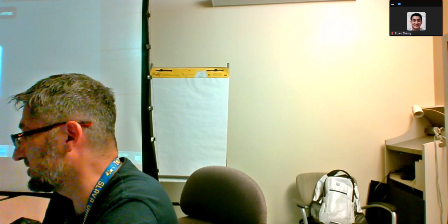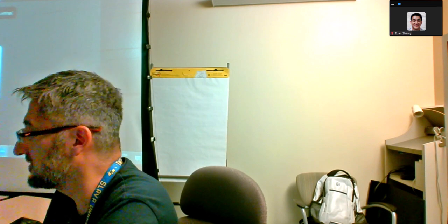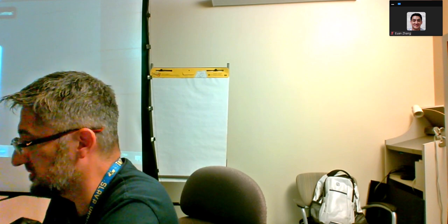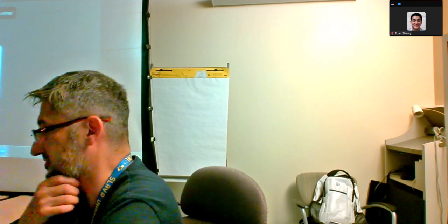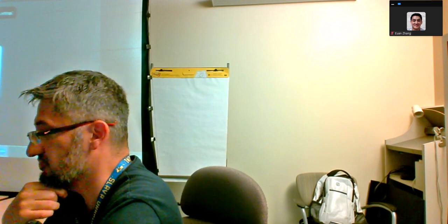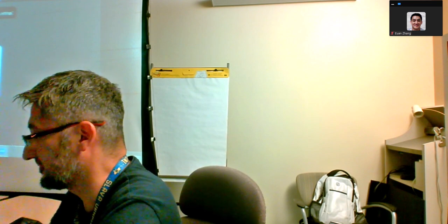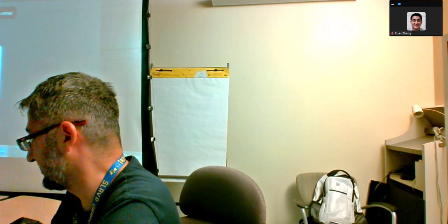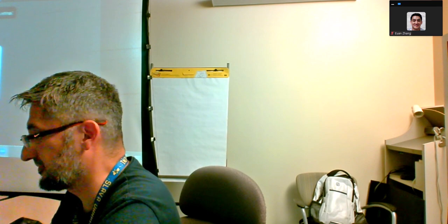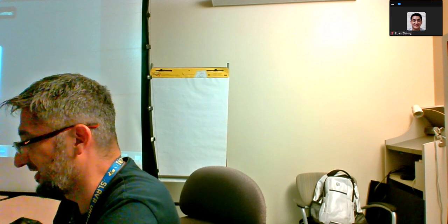Second question. What is the grade of the germinal matrix hemorrhage? Look at the images carefully. I will give you 20 seconds. Now. Okay, everyone answered.